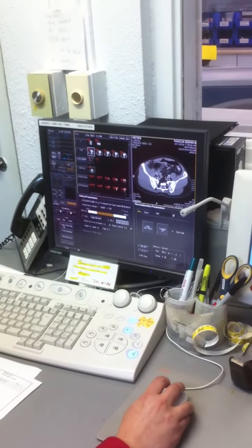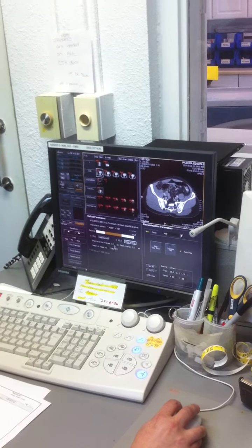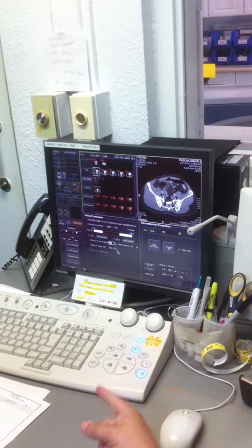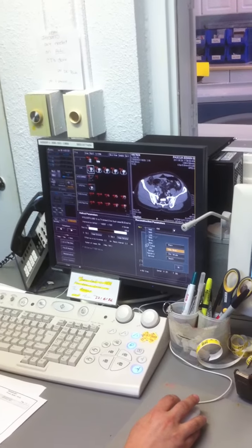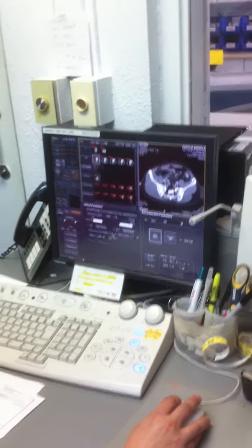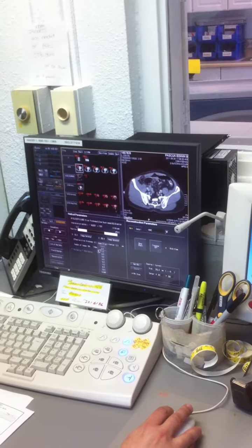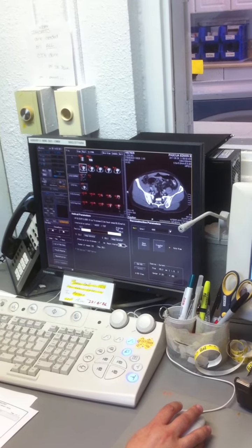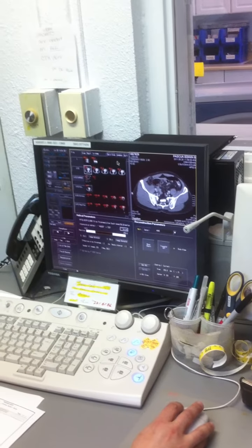Now I'm not going to bother making 3s and then 0.5s for the sagittals and coronals. Just make the volume right off the bat because it's faster to create axials in MPR than it is in raw data. So all I'm going to do here is make a volume. Now, when you go to 2 millimeters or under here, it always checks this box. But let's say you want 1x1s, but not in the volume. What can you do? Uncheck the box. Yep, uncheck that box. Just like that. Now that'll give you 1x1 regular images.